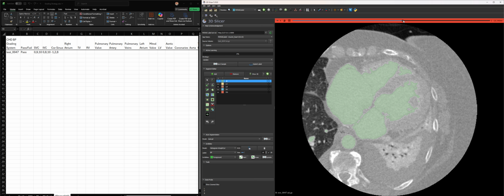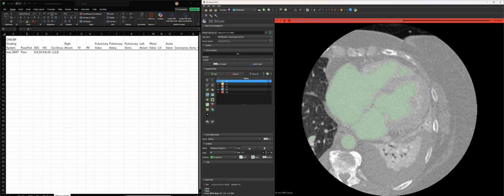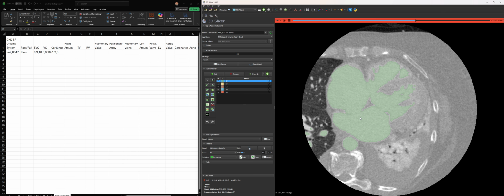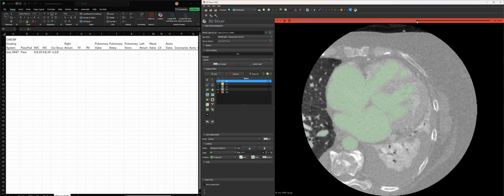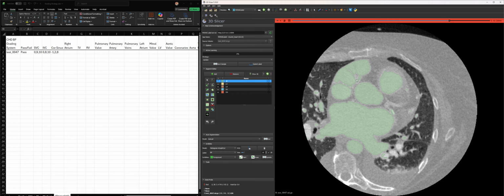So I don't do too much. I won't give a 10 if there's a fake communication here, but I don't penalize it for this because it's so hard to really see on imaging. Anywho, I'd say this right atrium is probably a 10. It's a very good scan, but it's going to be about a 9, because it doesn't get everything. So it passes. I give it a 9 out of 10.